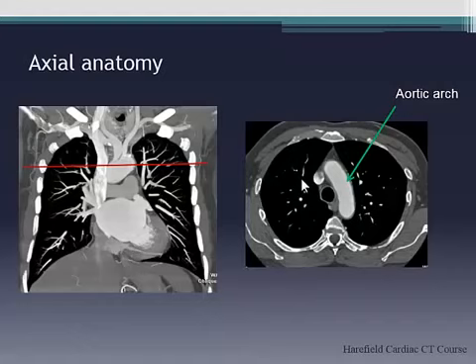If you see the brachiocephalic, which normally two brachiocephalics form the SVC, right? If you've got a left and a right, usually the brachiocephalics stay separate, so you'll see them go down. And the other clue, as you know from echo, is you look for a dilated coronary sinus, because a left-sided SVC drains via the coronary sinus.